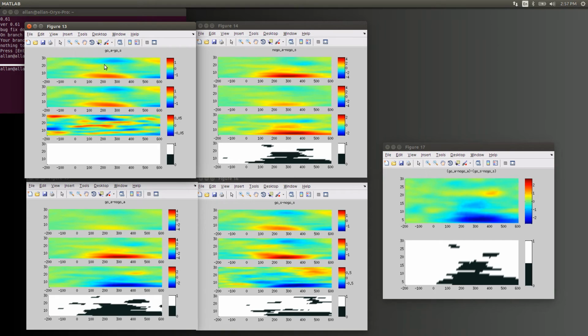So there are no statistical differences for that particular contrast. And we go here, we're now comparing no-go alert to no-go sleepy. So we see some alpha, mostly alpha.